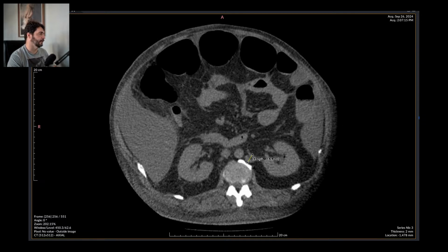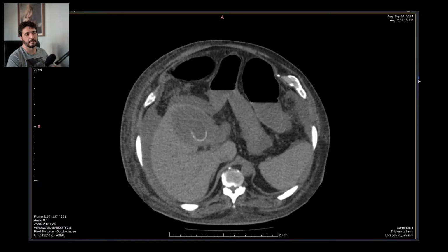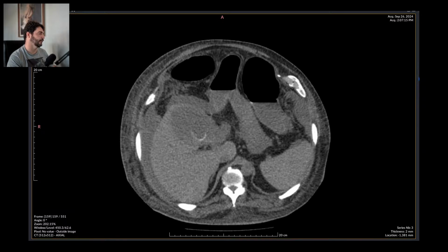Oh yes, this is a stomach ache. You guys could do better than that, but you just don't make a slight, just a tiny effort to make it any better than that.